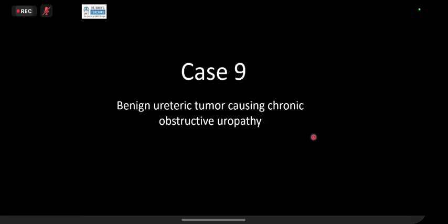Now, the urogram study was, I'll go through the case once I describe it. This was a long-standing entity. There was hydronephrosis. There was what we call obstructive atrophy of the left kidney. And the discussion point is, what is it?